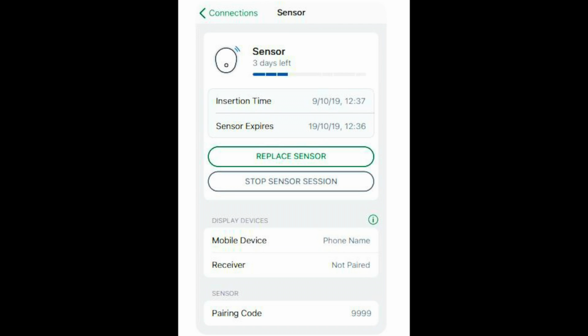It's just a lot more polished and easier to read the info than what we saw in the G6 app. Overall, this app is honestly just a lot prettier and more user-friendly from what I found. A lot of the features, even if they're not new, are just easier to access and look a lot more user-friendly in my opinion.